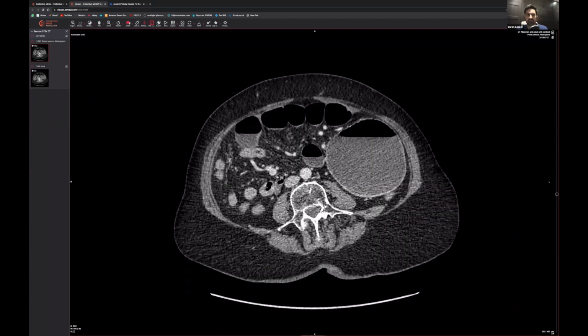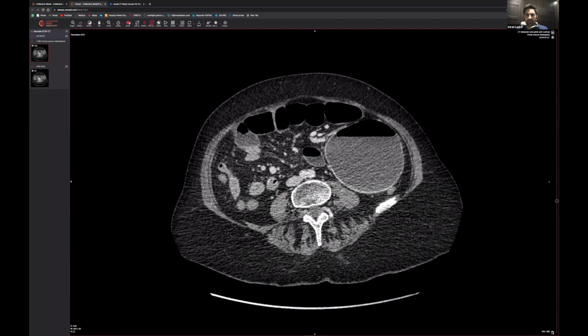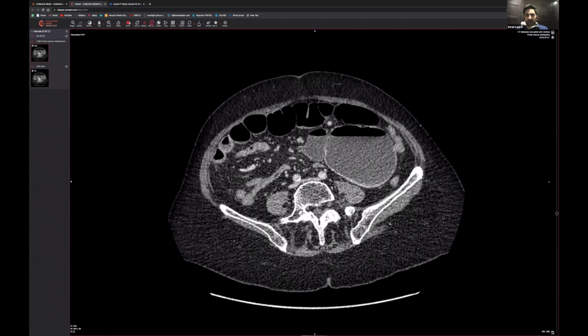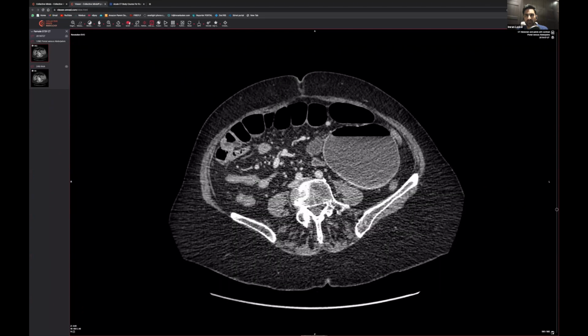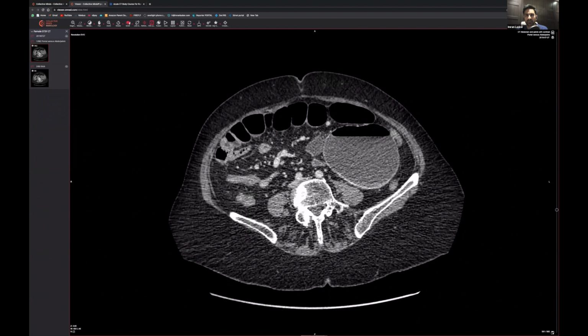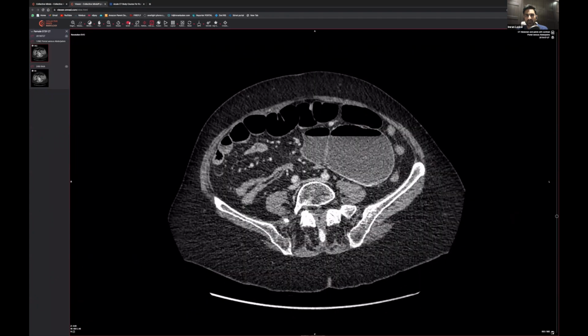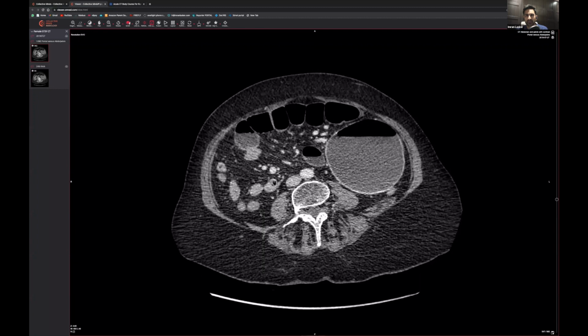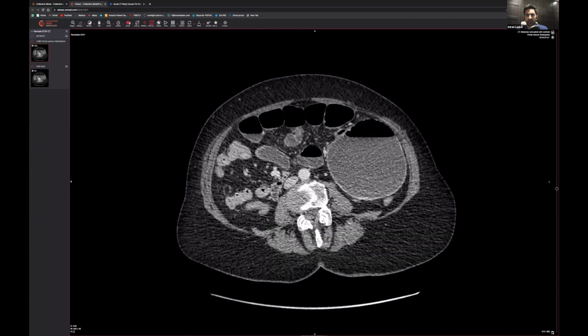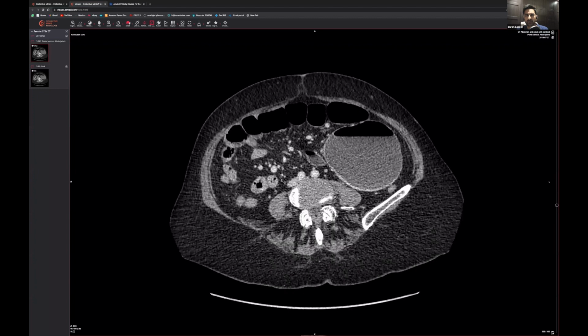Someone said stomach. Okay, yeah, good. That's a good call, good shout. So coming back this way. So we came up that way. Now we've got to try and figure out where we go from here. I feel like we go this way, don't we? What are people thinking? Down this way, down this way. Can we get down here now? Hope we're not following small bowel all the way along. Okay, now we've come up to here.